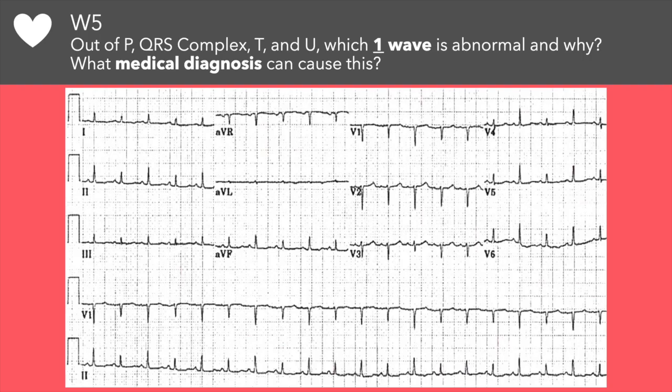We can even see sinus tachycardia throughout, and the massive pericardial effusion triad is actually a combination of number 1, tachycardia, number 2, low voltage, and number 3, electrical alternans. This ECG is suggestive of massive pericardial effusion.